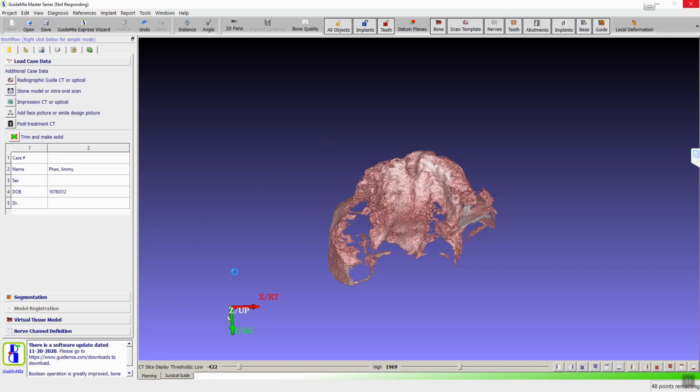Yeah. After today, I'm going to send you the updated version, so you can play with this. Oh, it's taking a little too long. Your clock's not spinning. As I say, we're on a remote meeting and we're recording, so it's slowed down quite a bit.